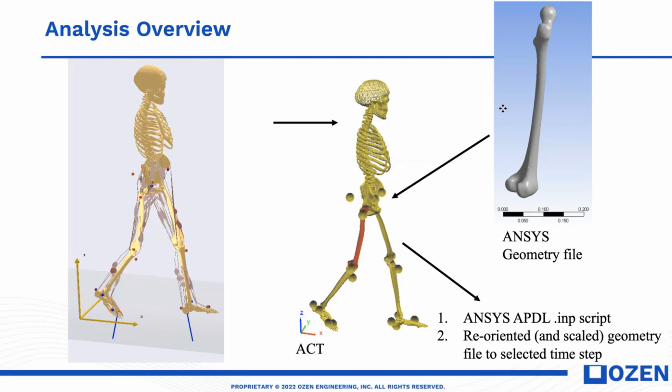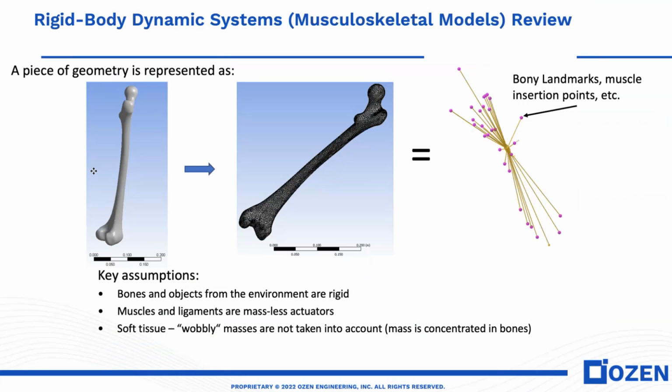And that's kind of the procedure. You start out with this musculoskeletal model. Then from there, you create a finite element model. And if it's a nonlinear simulation, then you will have to start iterating between them. When we do these finite element models, of course, the finite element analysis is going to assume that the bone geometry we are looking at is elastic.